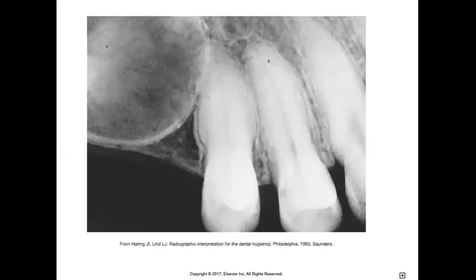So here in figure 35-29, we see a radiographic representation of hypercementosis. Here, the root areas affected are separated by periapical bone by normal appearing periodontal ligament space, and the lamina dura appears normal. So this is just a very bulbous looking root. There's usually no symptoms involved. And once again, it's just something that needs to be watched. The dentist will routinely look at the lamina dura and the periodontal ligament space to make sure they're all appearing normal throughout any normal examinations.